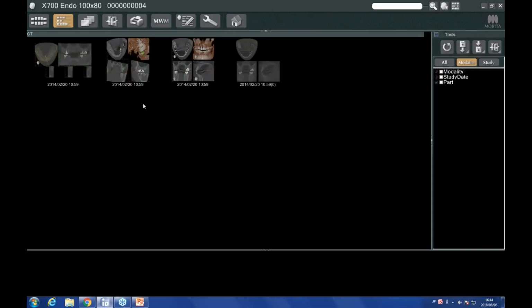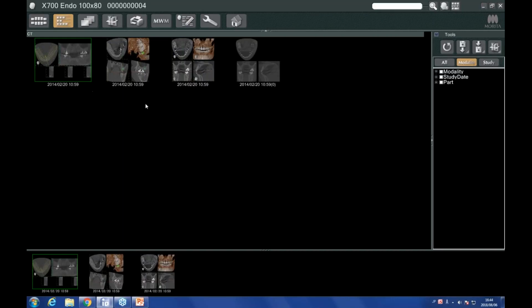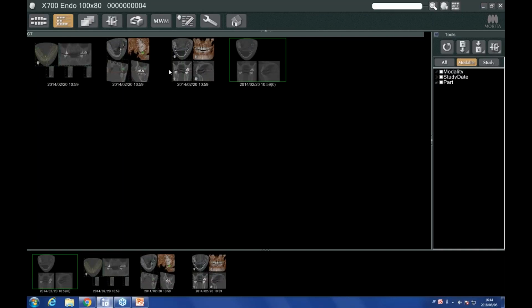And I just want to show you briefly what the difference is in the patient folder. You can see now there's 3 additional data sets created. Now these are not copies of the original volume, which is over here. These are actually those saved states that we took. We saved the contrast adjustment first. We saved our implant placement, and we also saved this curved reconstruction, this panorama.